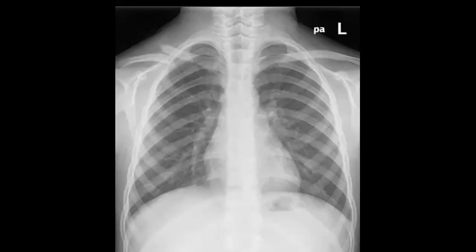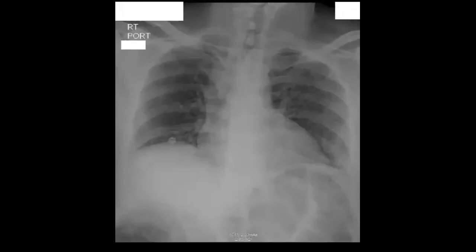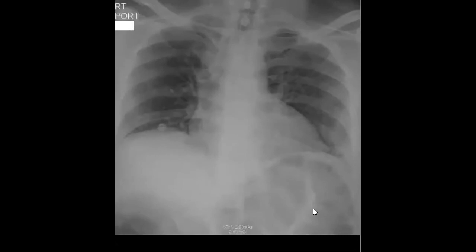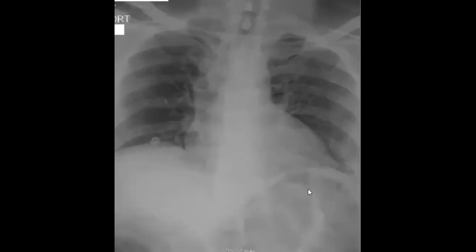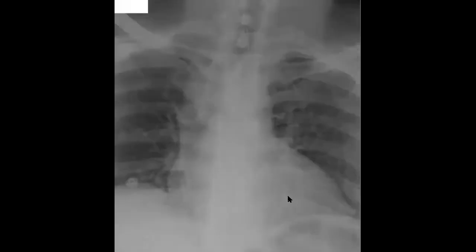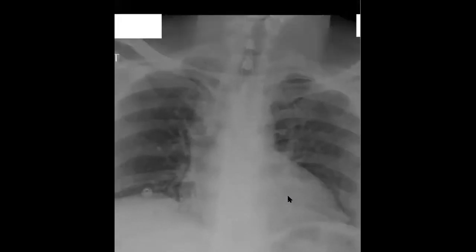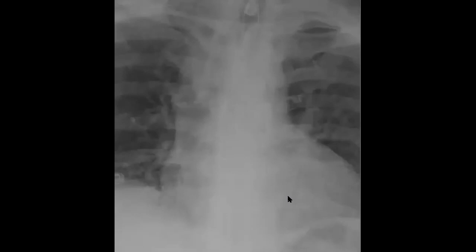Yes, displaced clavicle fracture here is an easy one. This one is not very easy, but let's try to help you with this. What is important for the exam, to be honest, is very important in the exam. Maybe you can see now.